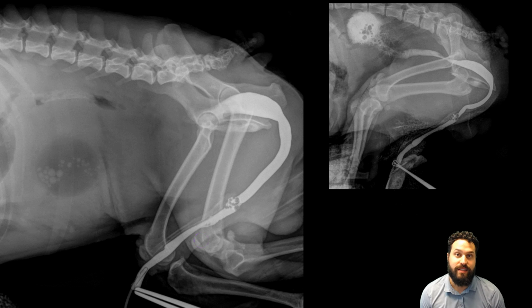In this instance, the clinicians actually also performed a retrograde cystourethrogram, and these are a couple images from that study. And one thing I just wanted to point out is that once we have a more opaque substance, in this case contrast medium, within the urethra, now all of a sudden those calculi, which were mineral opacity, are more lucent. And this is because of the relative opacity of the structures around it. So this is where they might look more similar to gas or filling defects, and these are the calculi persistent in the urethra at this level.